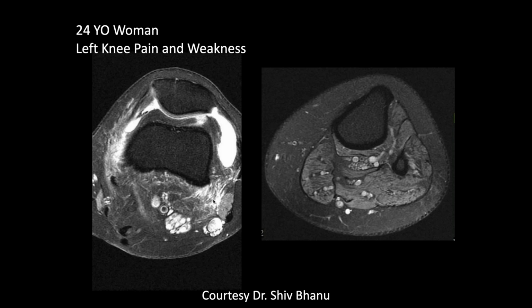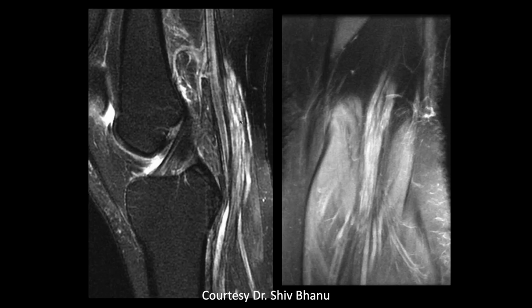And then just posterior to that. Yes. So we got these 2 areas here. This is at a different location. What do you think these might be? I mean, they could be cysts, but they look like they have a lot of septum in them. So you really want to see what these look like going up and down. Here is a sagittal image through one of them, and here's a coronal image through another.